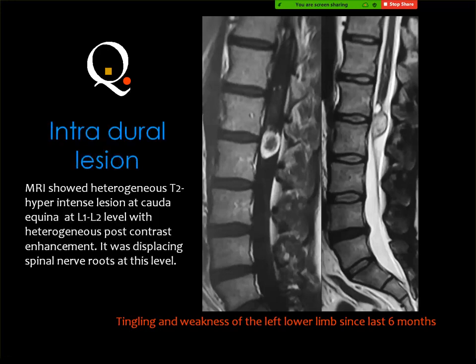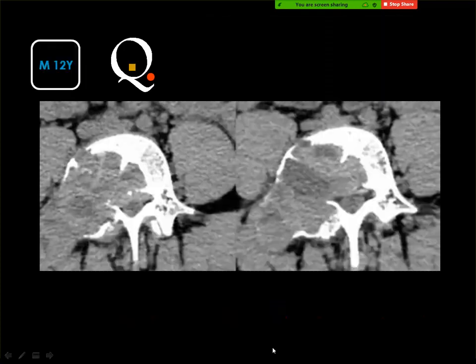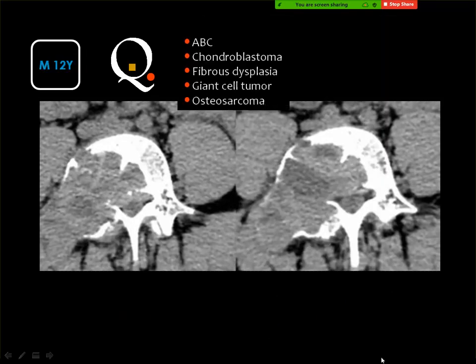Schwannoma. Yes, and this is a schwannoma showing the typical appearance with heterogeneous enhancement. Next case.